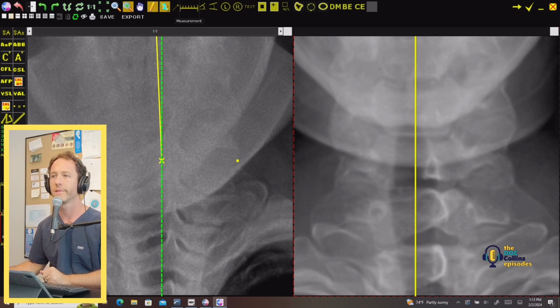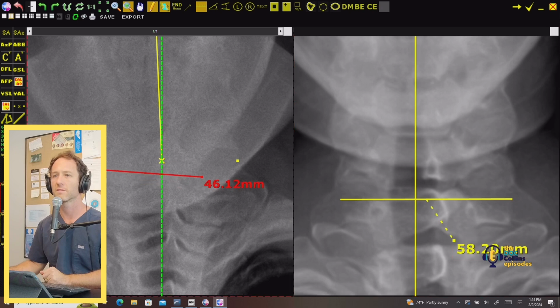So one, you know, before you even get into that frontal view, if you want to look at the width, right? You get a sense of the lateral aspect of this body, this margin here, or whatever. All right, so you know you should be somewhere around that width. So if you just wanted to throw that width up, because it's tough, right? It gets grainy, it gets messy.